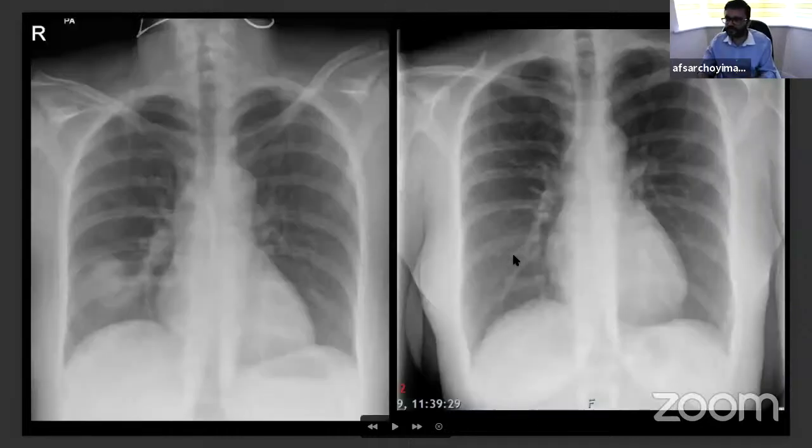The pneumonia, we'll discuss pneumonia in the next session. And I just want to show one case which is looking like a mass. It's actually a pneumonia, but it's a non-smoker presented with a partially treated pneumonia. So that's how it came, and it resolved with the treatment.